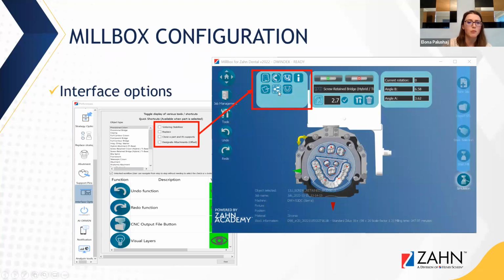If you notice that your stabilizer is missing for any of the bridge options, you can always turn that option on here. Of course, there are a lot more options that might not be listed here that we can add. For that, you would need to reach out to your support team, so we can work on that. And as far as removing what's already there, also please reach out to your support team and we can assist with that as well.